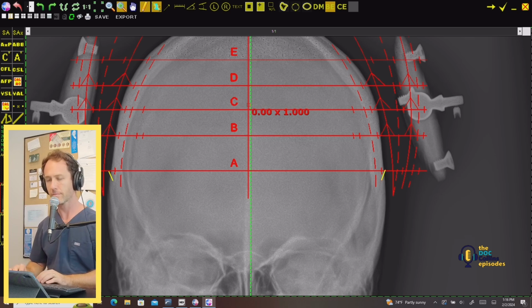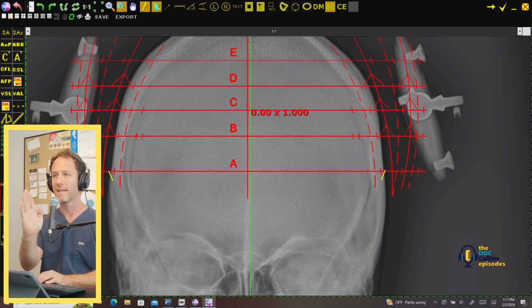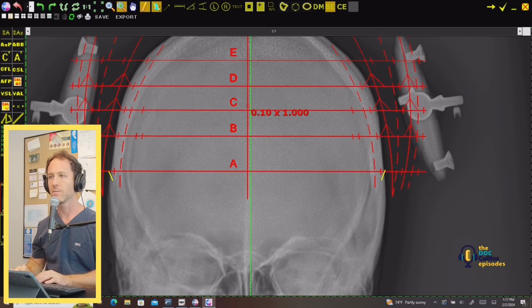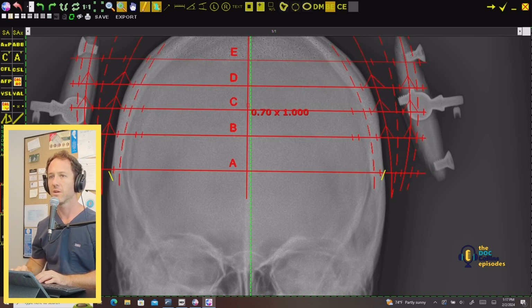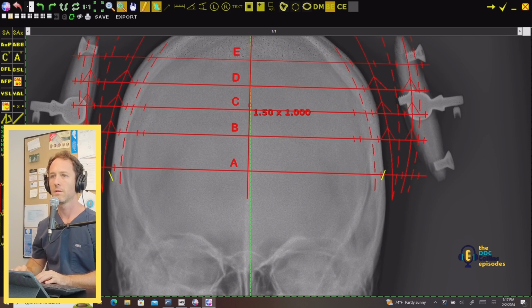But with this tool, I'm just above that suture line. And what I'm looking for is right to left sides. Do I have symmetry? So I'll be kind of sliding right to left and then tilting the tool, rotating the tool right and left, to have symmetry in terms of the skull in that A to B zone, which hopefully you can pick up decently with the camera.